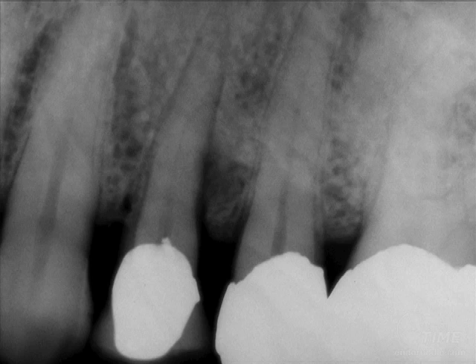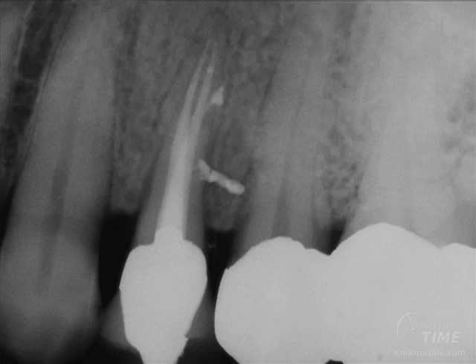You can begin to see the root is kind of complicated if you're looking for the canals moving all the way to the apical regions, and there doesn't appear to be much of a lesion of endodontic origin associated with the apical 1/3 of this root. When we went into this tooth, I'm skipping to a 10-year recall, you can see the fun of finding the 2 canals.